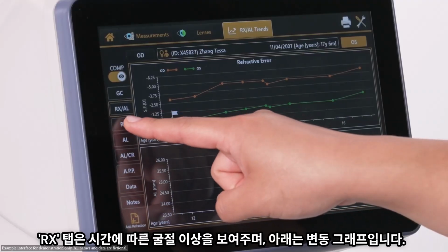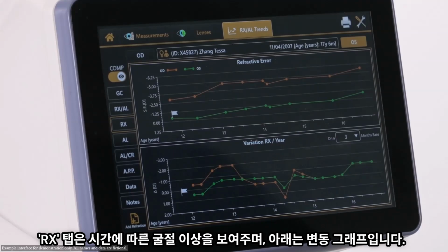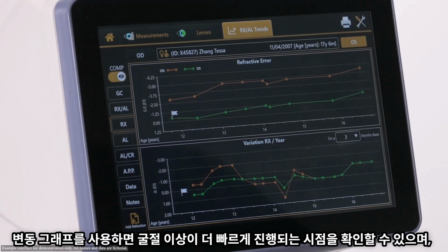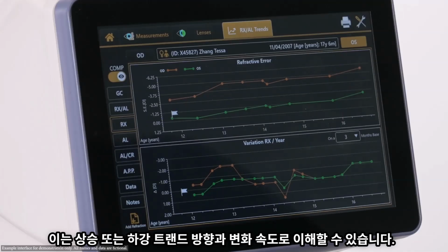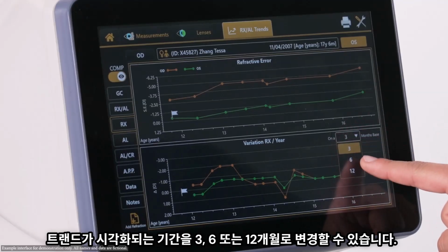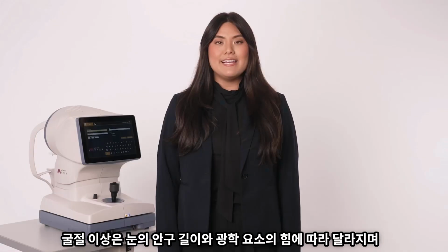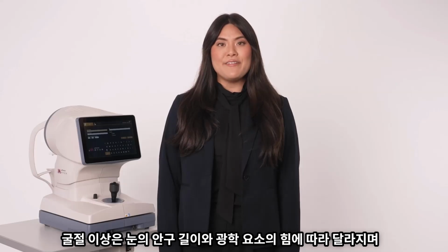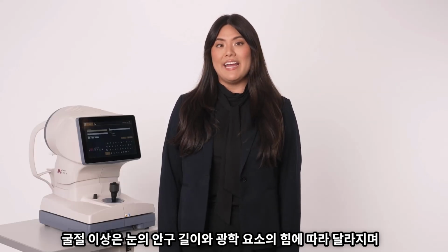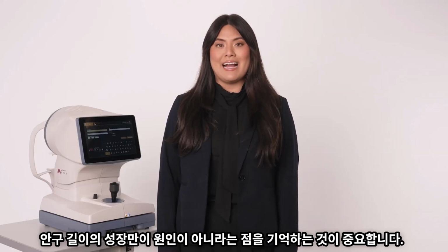The Rx tab shows the refractive error over time, with the variation graph below it. The variation graph allows you to visualize when refractive error is progressing faster, indicated by an upward trend, or slowing down, indicated by a downward trend. You can change the period of time over which the trend is visualized from 3, 6, or 12 months. It is important to remember that refractive error depends on the axial length of the eye, combined with the power of the optical elements, and may not always track the axial length growth.